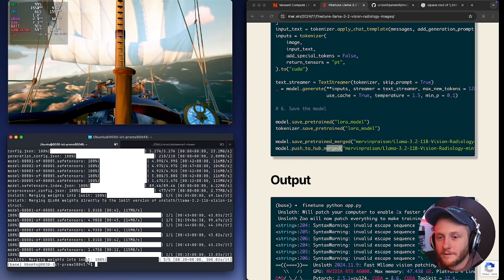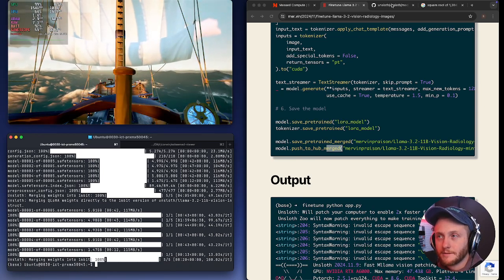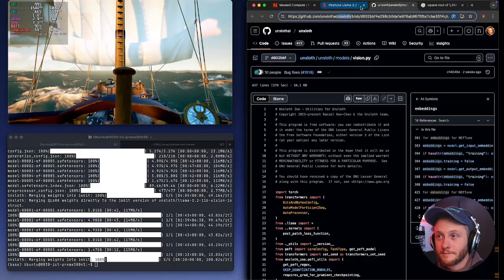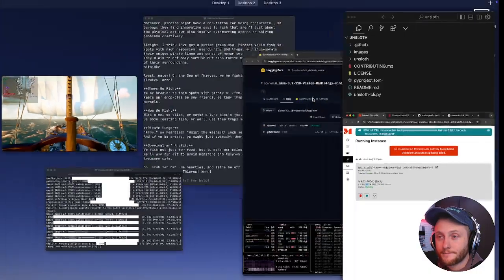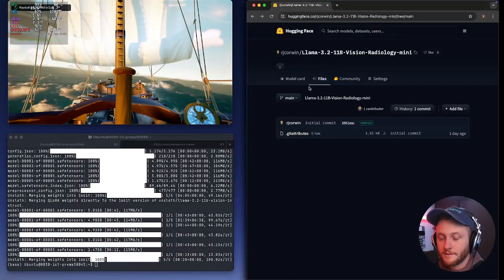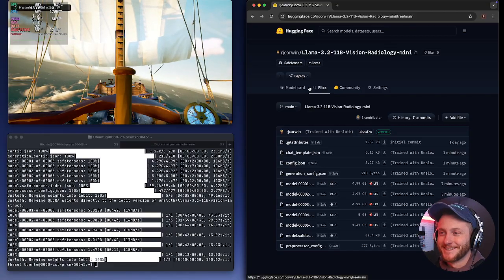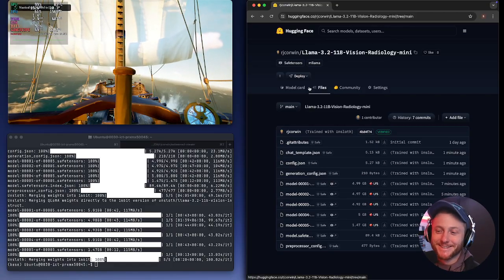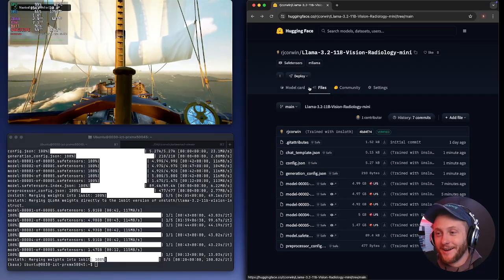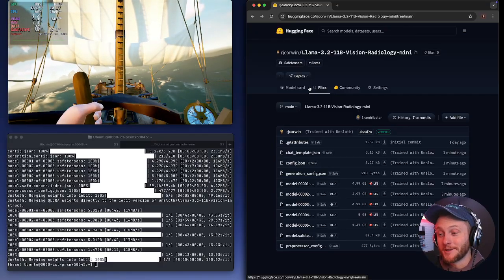We finished. No error. Is it time to see something we haven't seen yet? Nothing here. Reload. Something here! I have some stuff here.